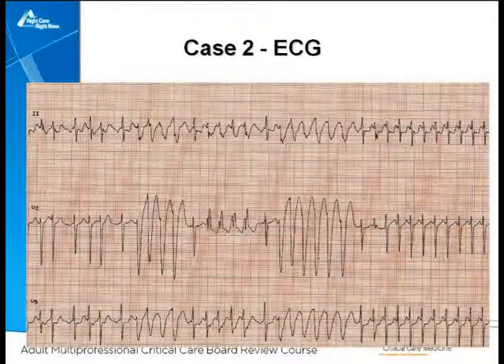So remember, this is not a 12 lead. This is leads 2, V1, and V5, as you can see.